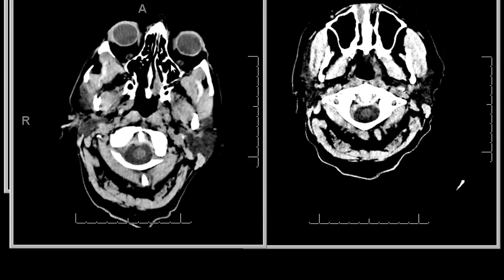Today I'm going to talk about the experience of our CT perfusion program on patient care in the past months. I'll just show a few example cases and share our experience. This patient had a CT scan in a small hospital that's about 30 minutes away from our main hospital.